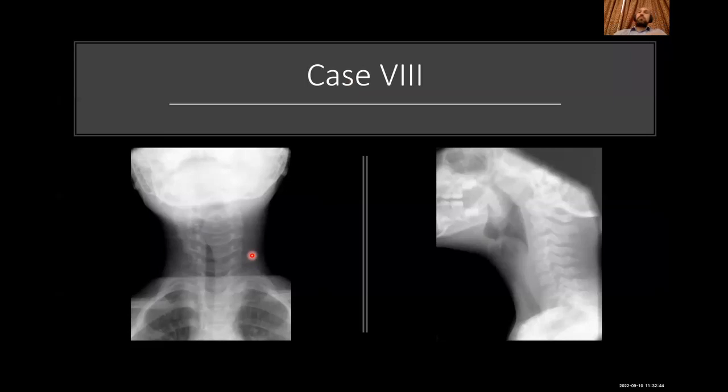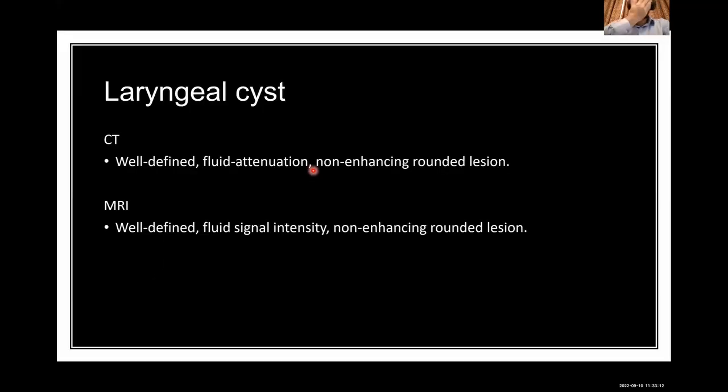This is the next case. What do you think? Are you sure? Who said croup? This is a laryngeal cyst. I think croup doesn't present in this way.